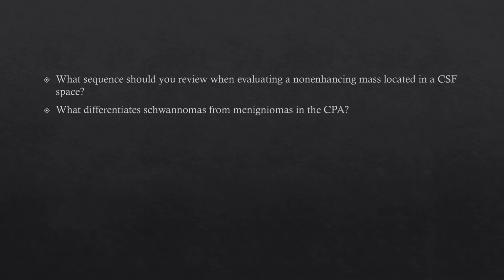When you see a mass in the area of the CP angle cistern, we want to think about a couple different questions. What sequence should we review when evaluating a non-enhancing mass? And what characteristics would differentiate a schwannoma from a meningioma?